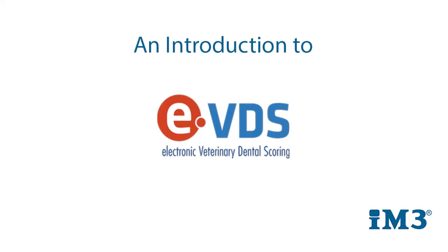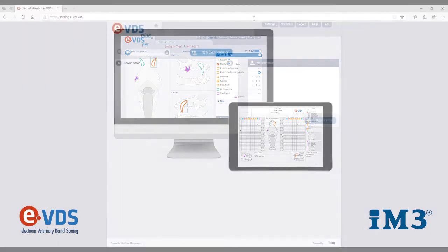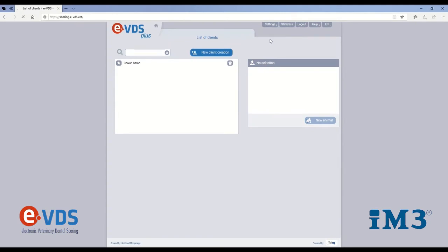Introducing the electronic dental scoring system. This is a digital way to chart your patient's mouth, helping your practice go paperless. e-VDS Plus is designed to make dentistry more systematic and encourages vets and nurses to fully examine and chart the oral cavity. It allows you to input your patient's clinical findings on digital charts, which provides thorough documentation and history for each patient. Getting started is simple.